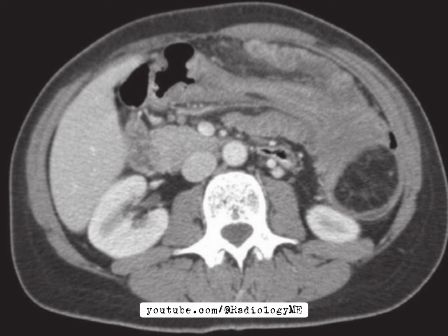So based on these findings, the diagnosis we are leaning toward is intussusception of the small bowel, most likely due to a benign lesion such as a lipoma. Liposarcoma, a more sinister possibility, is considered extremely unlikely here, but of course it cannot be entirely ruled out without histological confirmation. Now, talking about intussusception, it's interesting because it's quite rare in adults.